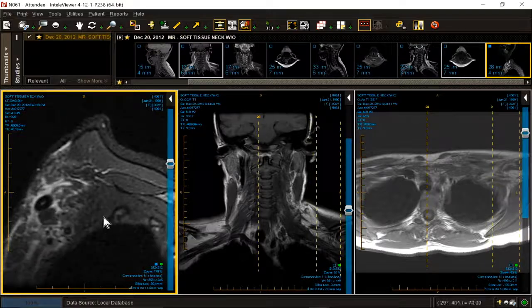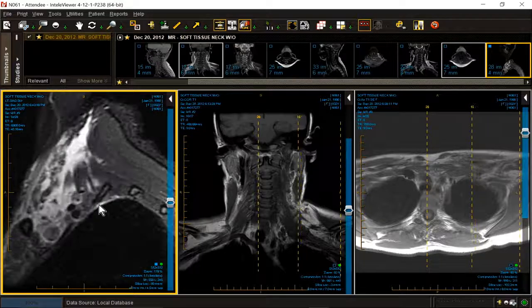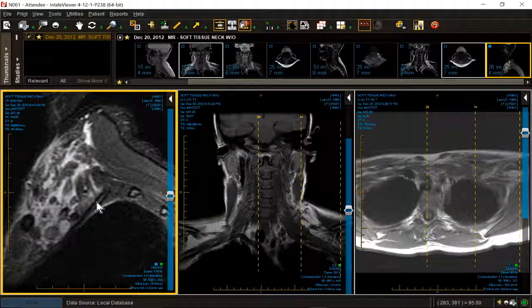So let's see if we can spot the first rib. We can. Let's get the highest rib right there. And so again, 3 zones from the cervical spine and superior border of the mediastinum. Sorry, the scalene triangle is the most medial. Intermediate is called the costoclavicular space. It is bordered by the subclavius anteriorly, which you saw, the clavicle superiorly, and the first rib and anterior scalene muscle inferiorly and posteriorly.